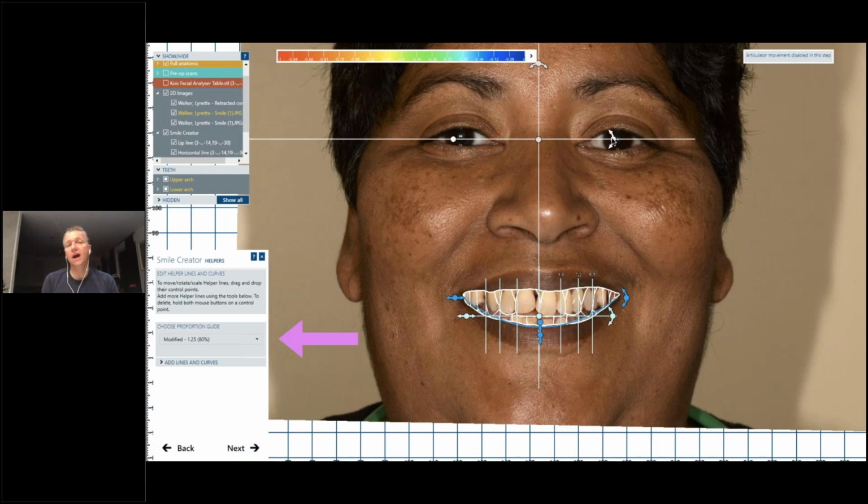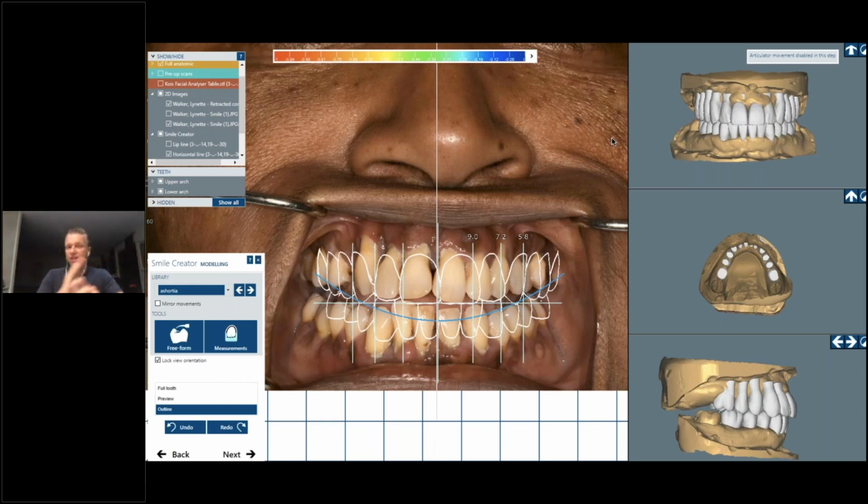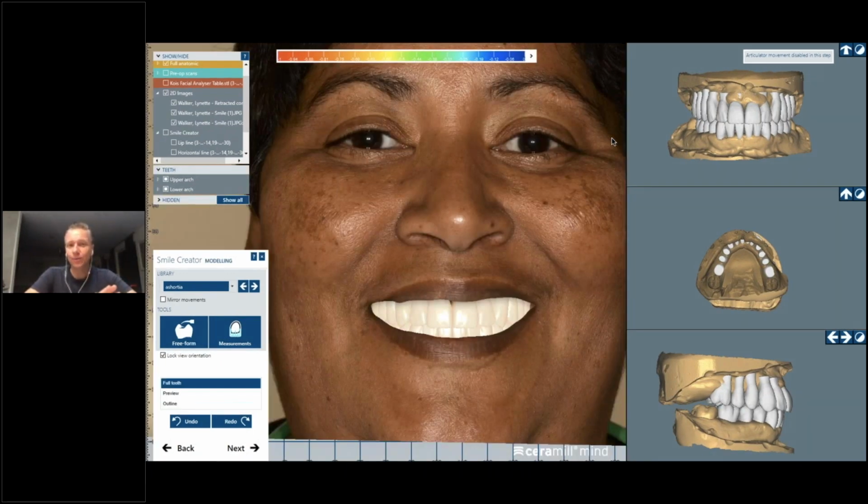So here now, again, midline, and look at the nose. The nose is not in the middle on her, so I also have to shift the teeth a little bit back and forth, position them properly. On the right side, again, you see in 3 dimensions, I can then play with the teeth. By the way, I can also adjust the tooth color. She wanted very bright teeth, so we put something brighter in. Then we look at the plan and see contours nice and easy. So I had to go back and forth a little bit with the color.